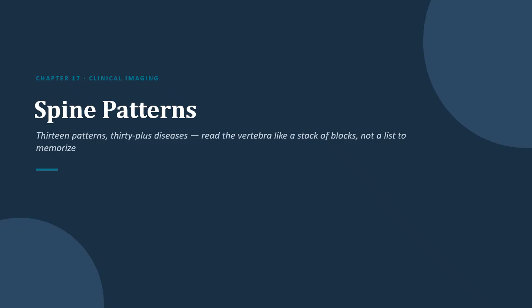Are they too dense? Are they too thin? Are they enlarged? Are they squared? Are they flattened? Are they damaged? Is one vertebra affected, or are there several vertebrae that are affected? If we or the radiologist can identify this, that gives him or her a better choice or start at narrowing down what the actual disease is that might be responsible for what we're seeing on the image.